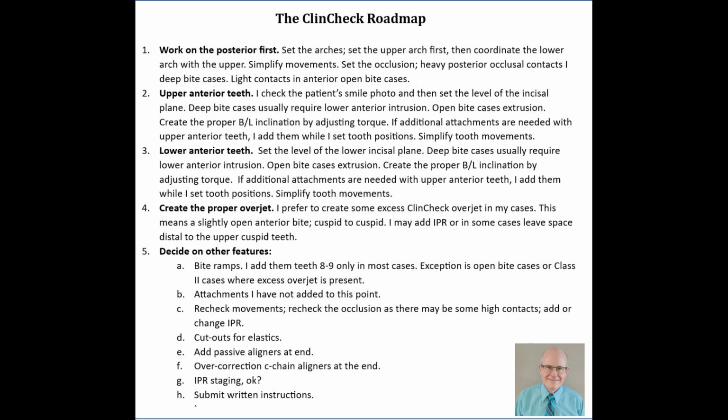The first thing I do is I always work in the posterior first. This is where I set the dental arches. I'll always go for the upper arch first. I'll set the proper shape, the proper form. I'll set it up for function and for aesthetics. And then I go down and coordinate the lower arch with the upper arch. I use the 3D controls to do all this.